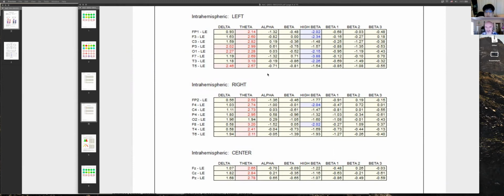How can you tell the fast brain? Because I can tell you're being dragged down. The negative numbers are a function of the delta. The highest positive number is only 0.6. Yes, but that's fast for a brain. 0.6 is fast. And 0.6 is fighting through a lot of negative numbers.